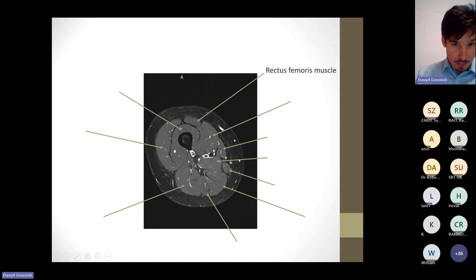The reason why I would say that is we've got this classic teardrop shaped muscle here, which people feel free to just chuck in the group. And we've got another muscle just behind it here. So vastus medialis sits just anterior to the tear-shaped muscle, which is sartorius. Lovely.